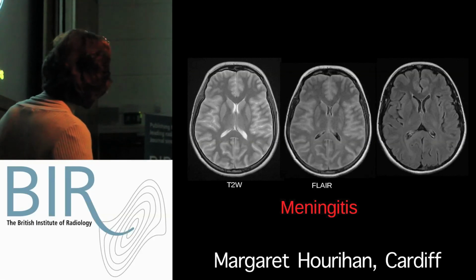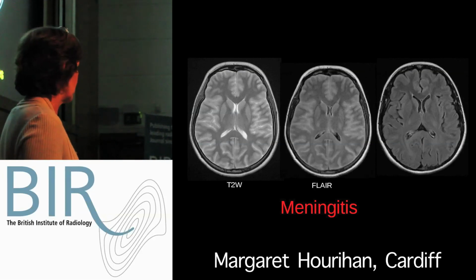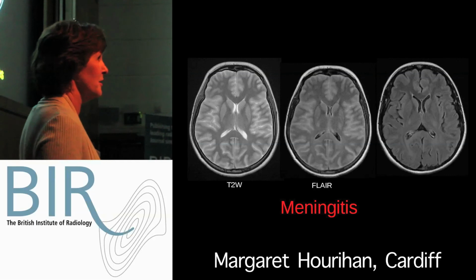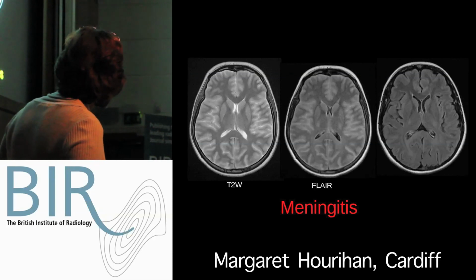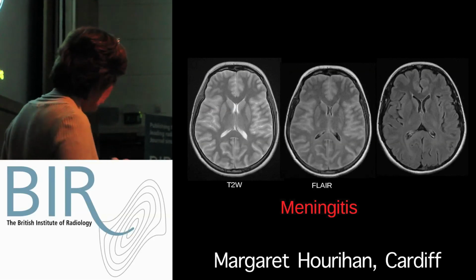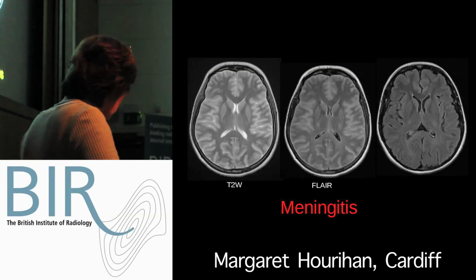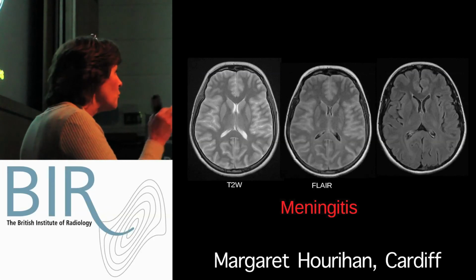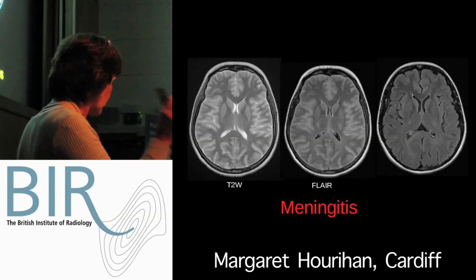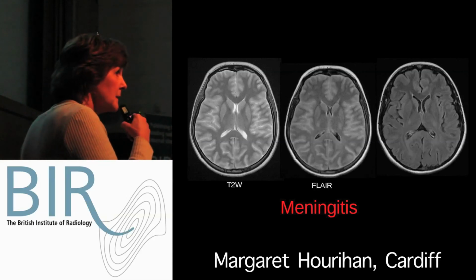I think when she came in with this, they thought, oh, she's got venous sinus thrombosis, because that's usually what they have, 3 weeks postpartum with seizures. But there was no evidence of increased density along the sinuses, and she's just got diffuse swelling there. So if you've got a patient with a normal scan, or you can't work it out, there's obviously something wrong with the patient, but you just can't work it out, then do MR, and that's the MR.